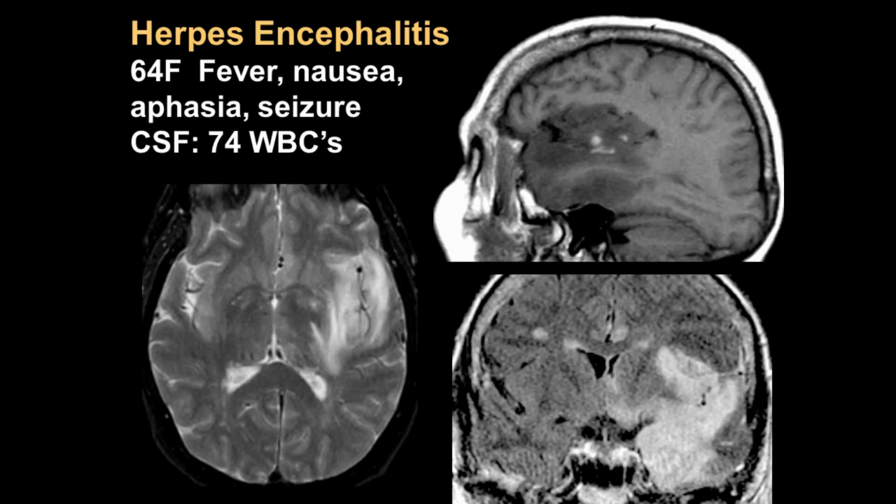So let's look at some examples, and this won't be any surprise to you. What are we thinking of when we see a patient in the emergency department with new seizures? Well, certainly acute infections like viral encephalitis. Here, the most commonly identified one, herpes simplex type 1, in a patient with new seizures with only a day or so of prodrome of confusion.